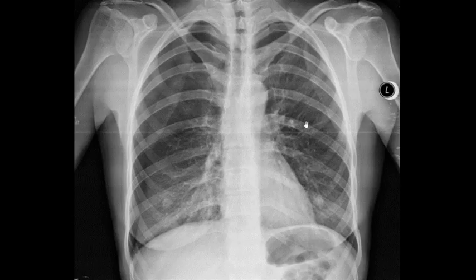In order to be proficient in analyzing this, here are the basics laid out. Only now with quantity, with looking more and more at normal and at pathological X-rays with pneumothoraxes, after some period of time, the eye gets accommodated, I would just say it like that, to these images, and the identification becomes more and more easier until you become a pro.